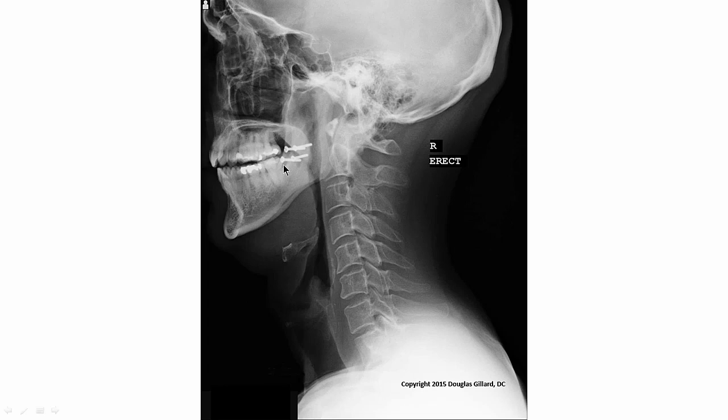All right, let's get to some stuff here. I know it's not on your list, but it's such an important structure. This little holder right here, this little cave, is the sella turcica. Next in gross 2, we'll learn a little bit more. The dorsum sellae is here, the tuberculum sellae is here. There are different parts of it, but for now let's just call it the sella turcica, and the pituitary sits in there.